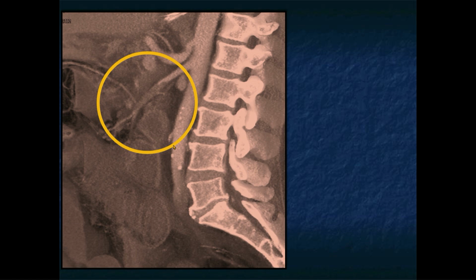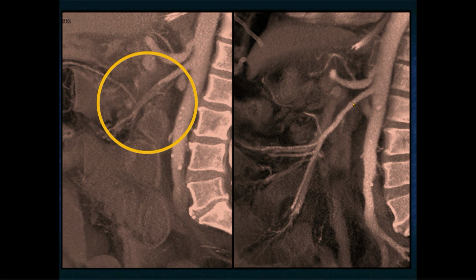This patient went to surgery. Here's the patient a week later. They removed the clot. The patient did fine. There was no need for bowel resection, so this patient was very lucky. But you can see the ability to visualize that occlusion, yet the vessel proximally looks very, very good.